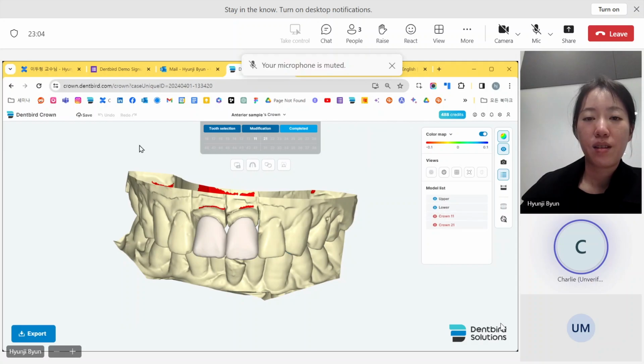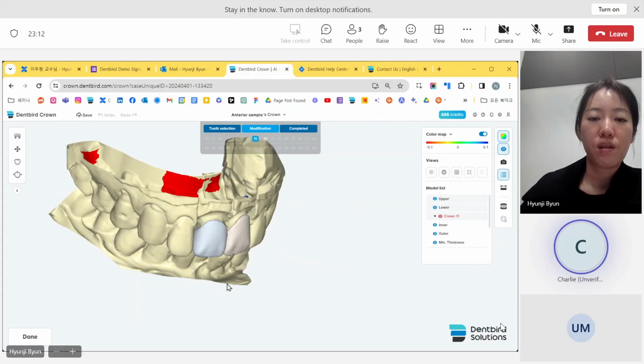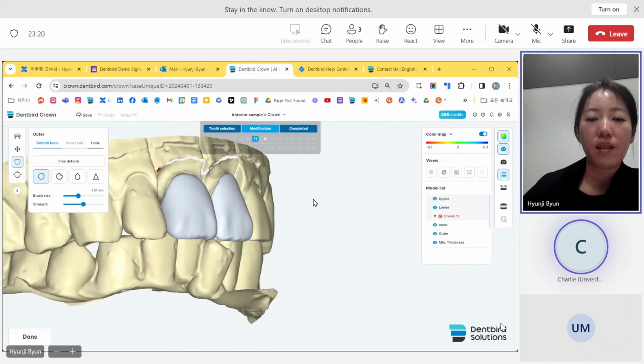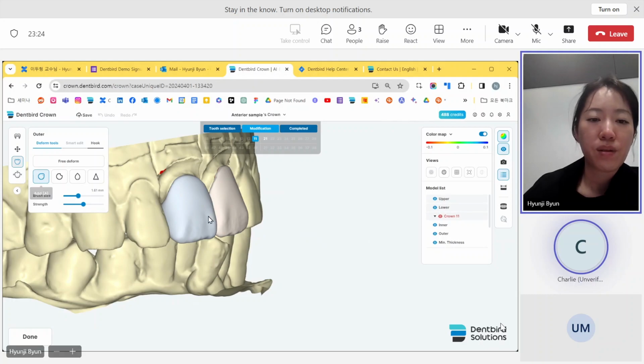So in the future, if we do take some cases, can we share them with you, and you can give us some idea whether this prep is okay or not? Yeah, and I'd like to do at least one case with you today. Can you look for a crown to do right now?